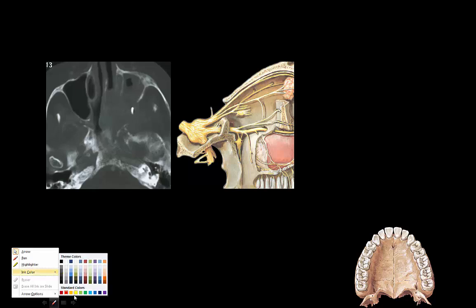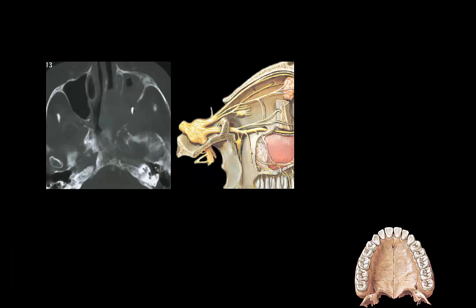So anytime a tumor of the hard palate extends back involving this, let me just draw this out real quick here, because I love to draw, right? I didn't have a lot of money growing up. I couldn't afford an Etch-a-Sketch, so now I finally can Etch-a-Sketch here, right?